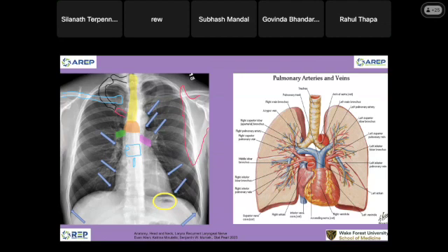Okay, so let me go back to anatomy again. When we read a chest radiograph, you are responsible for everything. I'm talking about this structure right here. Is it the tracheobronchial tree? Let's look. Yes, that's good. That is correct.